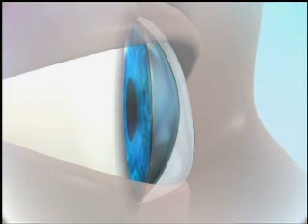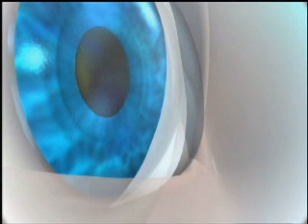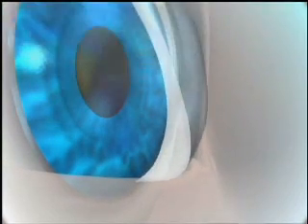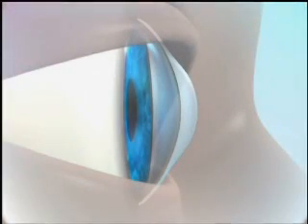Traditional toric lenses, such as prism ballasted designs, are thicker towards the bottom. By creating this thickness differential, designers believed the upper lid would squeeze the lens into position. Actually, by having a thicker area near or under the eyelid, movement is accentuated. A thicker edge means more interaction with the lower eyelid during a blink. More interaction means less stability.